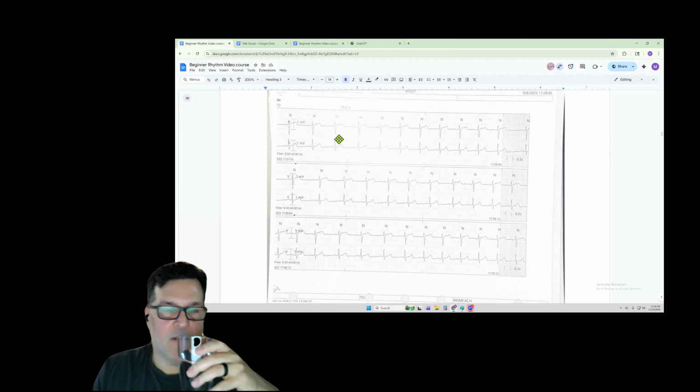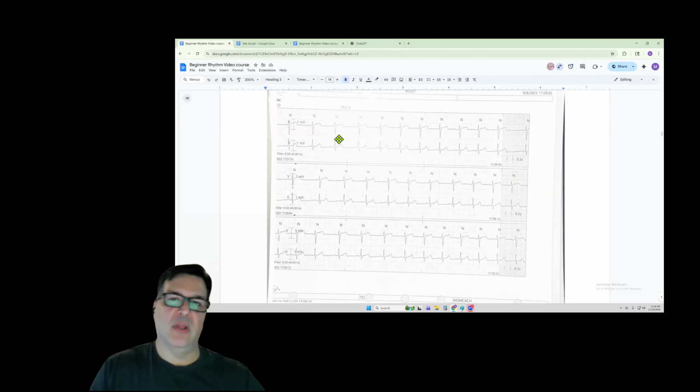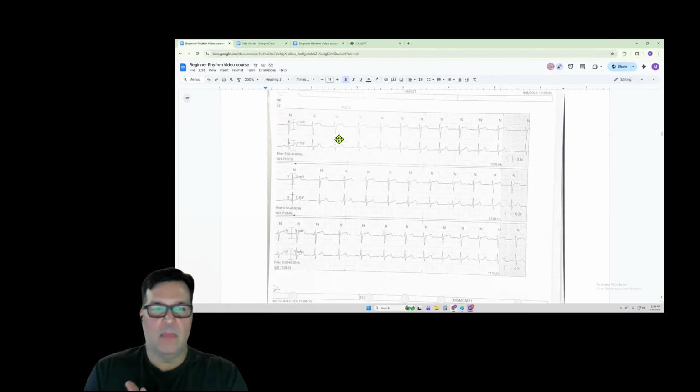So that's just regular from breathing, and it's called a sinus arrhythmia, where in sinus rhythm, the rhythm means regularity. Arrhythmia is irregular. And you said breathing out, it increases?